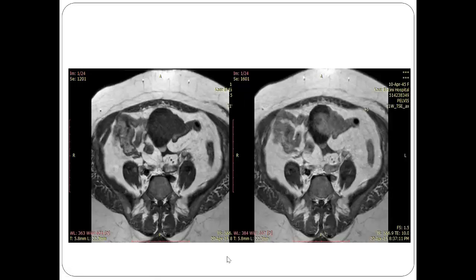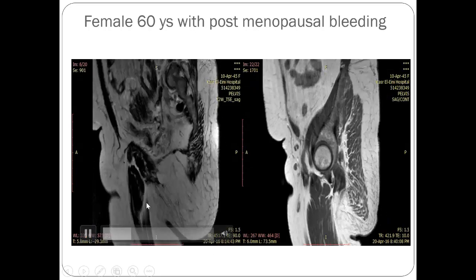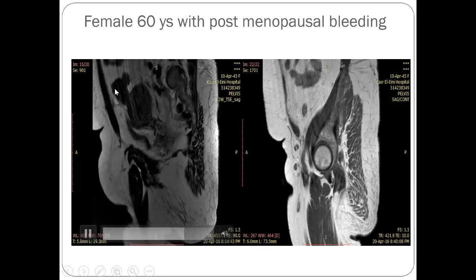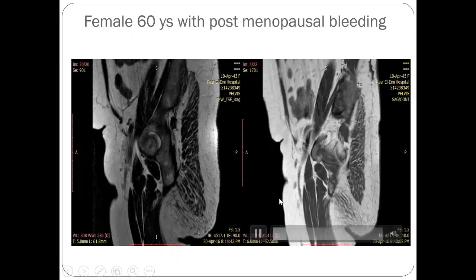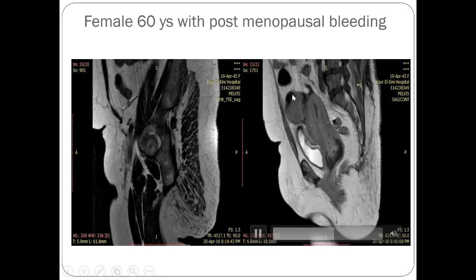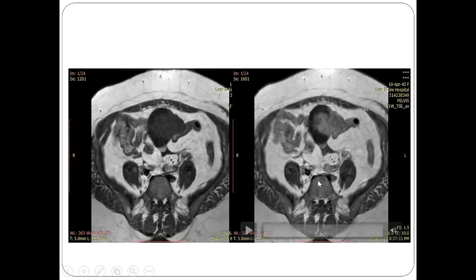And here also there is something else. Look here on the video. I think this case is in the group also. There is another lesion here in the adnexal area. Here. And this lesion is taking homogeneous enhancement also. This lesion, slightly tubal in origin, and here.